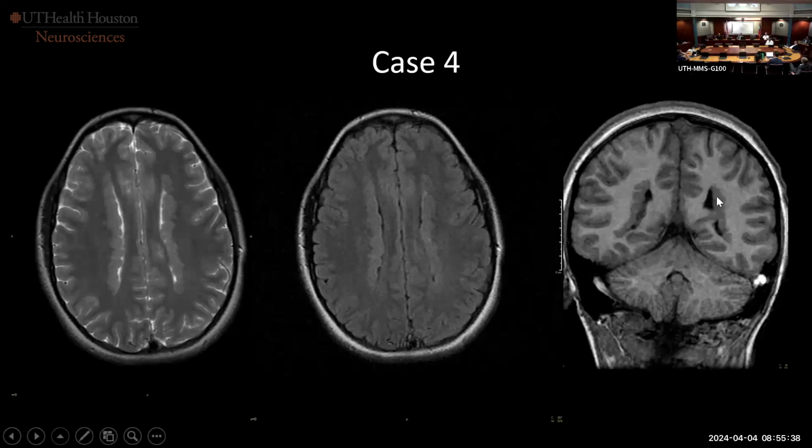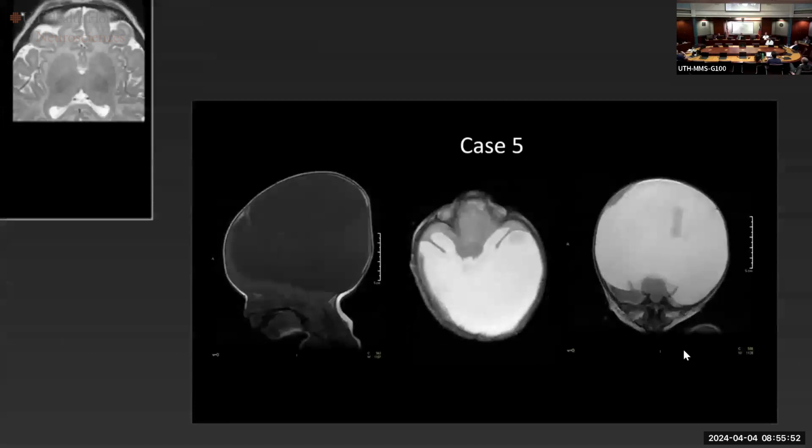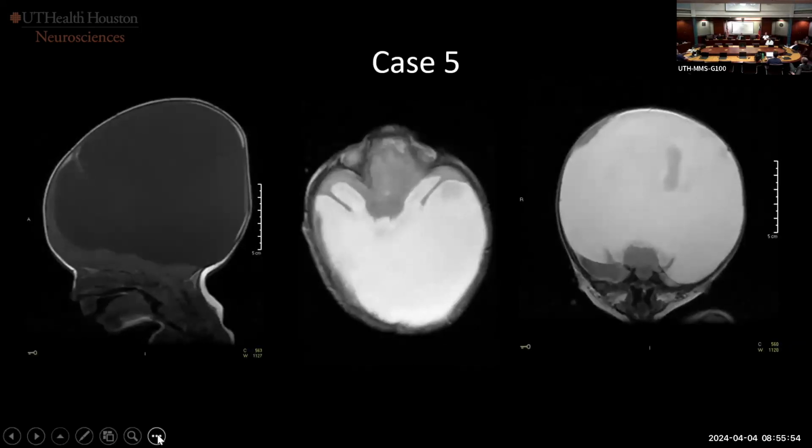You can see how nodular it is. You still have cortex, but you see there's thinning of the cortex up here, so not all of the cortex is normal. Remember, it always follows the cortex in all sequences. And in this one there's a big pancake there. So you look at the fusion of the thalami. I brought you guys to look at that.